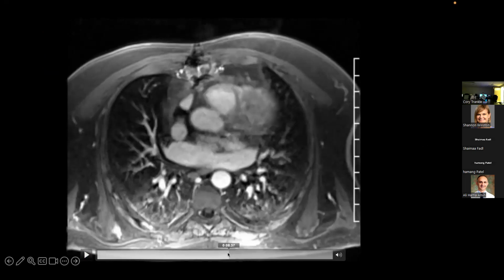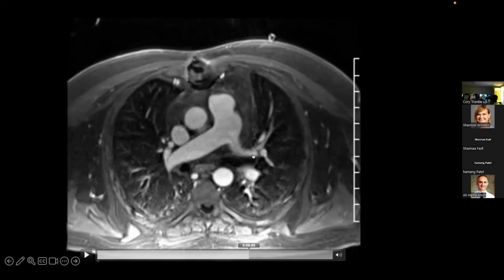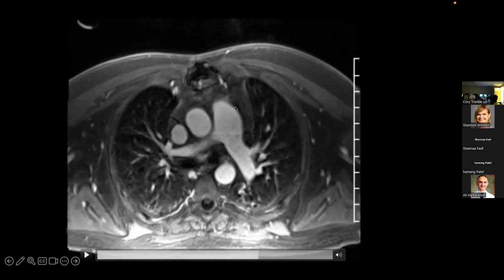And then look at the pulmonary artery. You will see a waist-like location or caliber change because of the anastomotic site. And at the same time, this waist-like appearance in the aorta. Note that there is no outpouching, there is no abnormal configuration of the arteries.